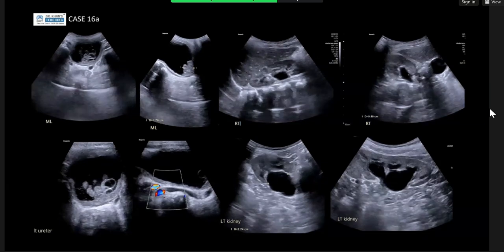My differential diagnosis here will be rhabdomyosarcoma of the urinary bladder, less likely clots or any hematoma within the bladder to cause such bilateral hydroureteronephrosis. Less likely transitional cell cancer, which is more likely seen in adults. So I would like to inform the referring clinician and do a pediatric urology or a cystoscopic evaluation and biopsy of the mass for further characterization, and do staging. Okay. So it's good.